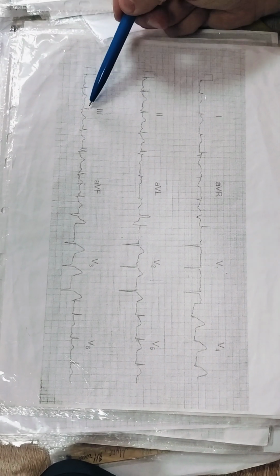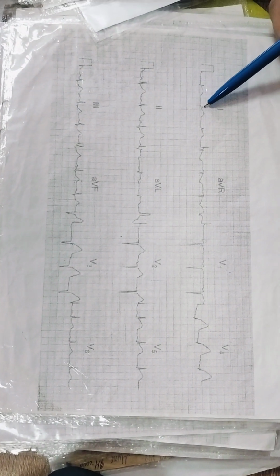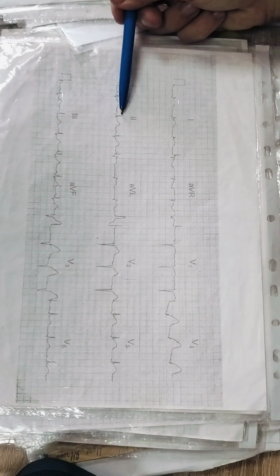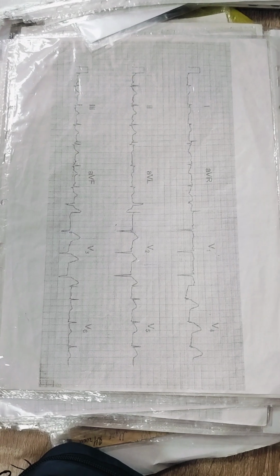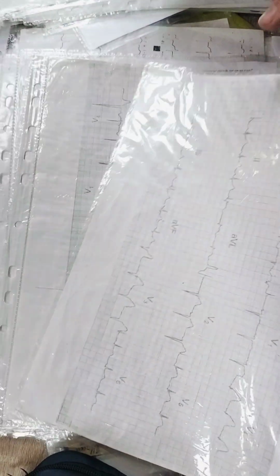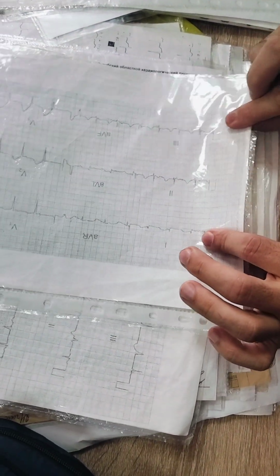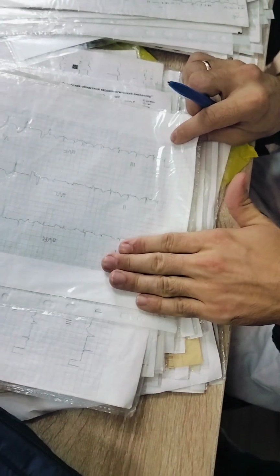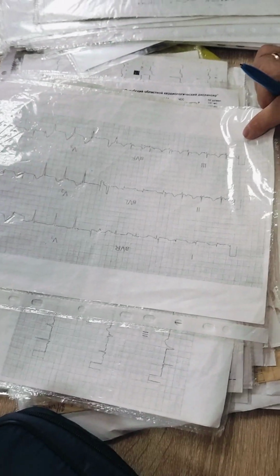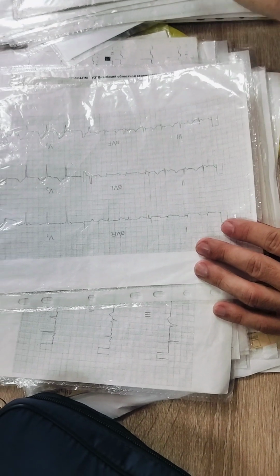About 4 millimeters. This one is 3 millimeters. So this one is the biggest. Left hand is the first lead. Right hand is the third lead. The biggest wave is in the middle, so the electrical axis of the heart is normal. If the biggest would be in the left hand, it is left shift. If the biggest would be in the right hand, it is right shift.